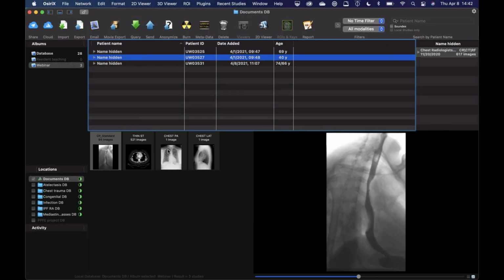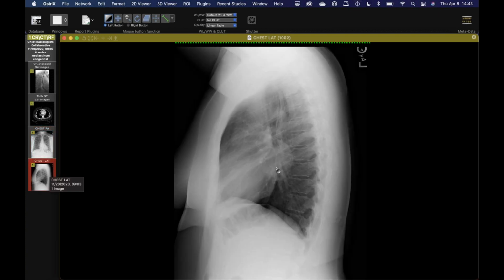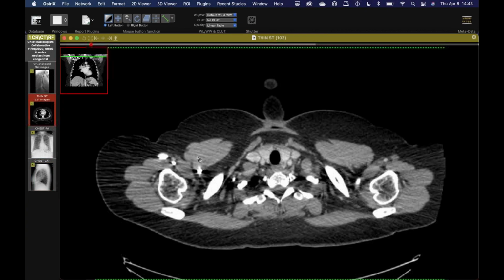All right, this is just kind of a classic case. It's a good medical student, first-year resident case, but it's one I got path on in multimodality imaging. So this patient has this mediastinal mass here, and you can see it's separate from the right heart border. So it's not in the prevascular space, and on the lateral view we can localize it nicely in that subcarinal region. So most of the time we see these as bronchogenic cysts.